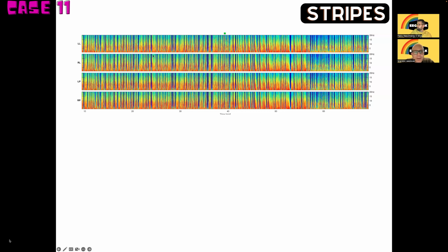Well, there's less of the EEG that is suppressed. I guess the suppressions are probably briefer. So it's a good way to estimate the burst suppression ratio too, right, if you look at the spectrogram? Yeah, you could. So what would you guess it is here? I don't know, like 30%. Yeah, that's my guess. Maybe 20 or 30.